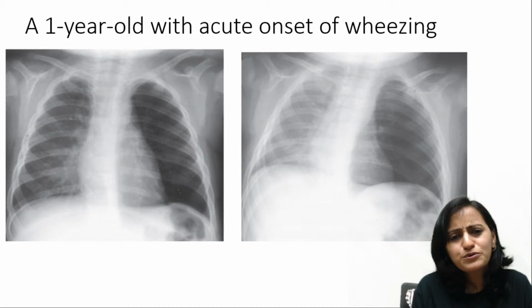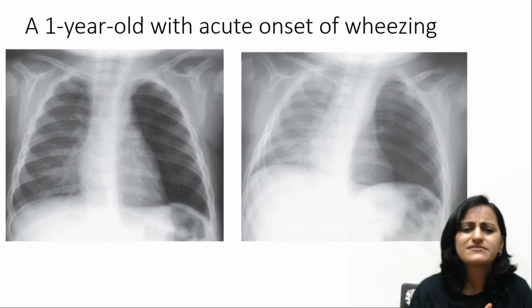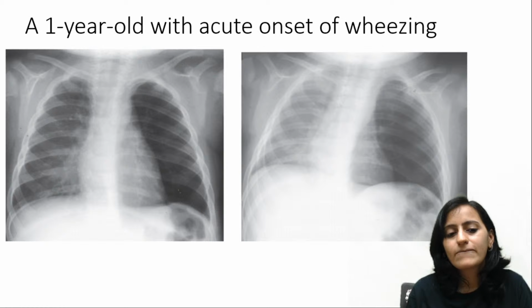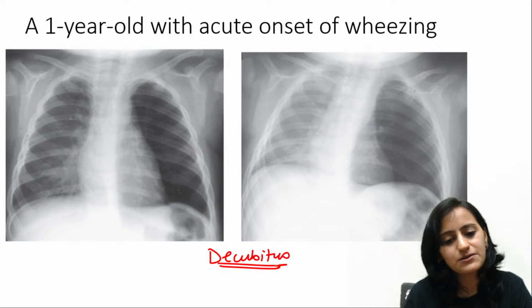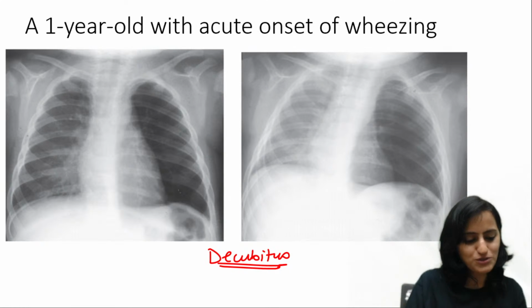Any other view or anything else that we can do? If the child is uncooperative, then we do a decubitus X-ray rather than directly going for bronchoscopy.